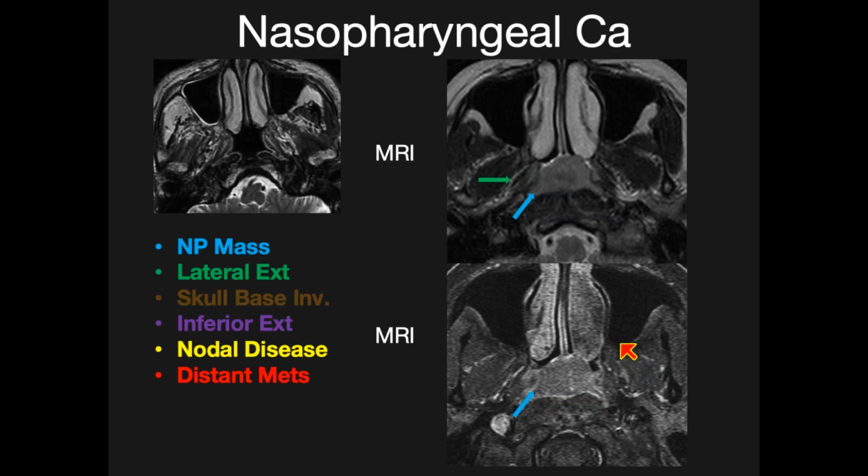The last bit of my talk will highlight imaging in head and neck cancers. This is not very exhaustive, it's just very quick examples of cancers of the upper aerodigestive tract. So this is the nasopharynx; to orientate, that's the maxillary sinus, the turbinates, the postnasal space. This is where the nasopharynx is. This is normal, and this patient has got a large mass sat within their nasopharynx.